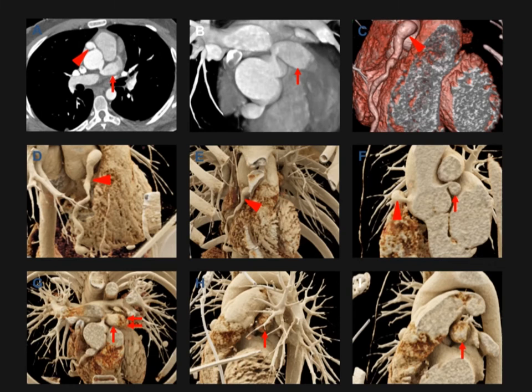axial. The upper row shows the typical volume rendering with or without color. And then the bottom two rows show you the coronary artery aneurysms, the RCA aneurysm in the first row, and then also showing you the large aneurysm of the left coronary artery. And again, multiple projections, multiple visualizations to optimize the study.